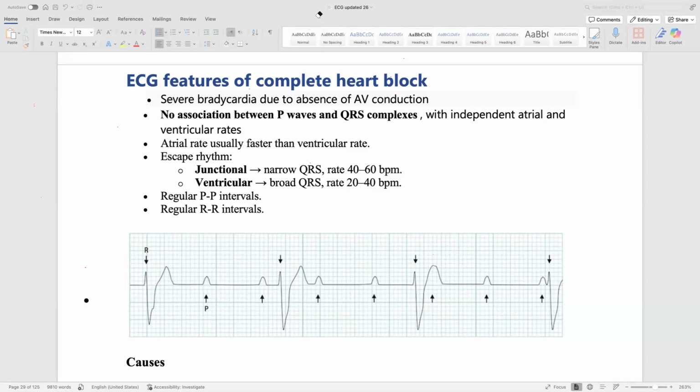You got this point? Yes, there is no mismatch. The P and R relation is lost. There is a P absent, P, P absent, P a long time, then R. But there is no matching.